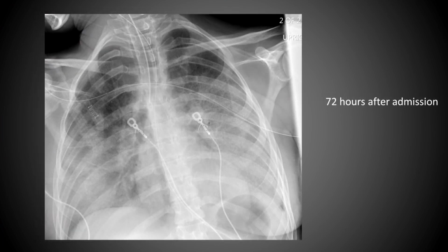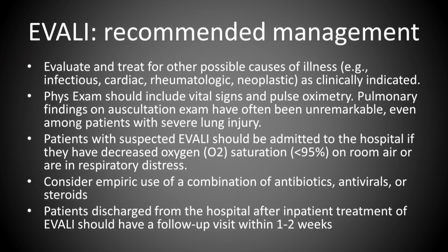And this is 72 hours after admission, and you can see she's intubated. We probably need to pull that endotracheal tube back, but she is very sick, and they're calling in the clergy and her parents and thought we were going to lose her. So she was very, very sick. And at some point, they start piling on the steroids, and the steroids are what's going to help reverse this inflammatory process. So here's the recommended management.